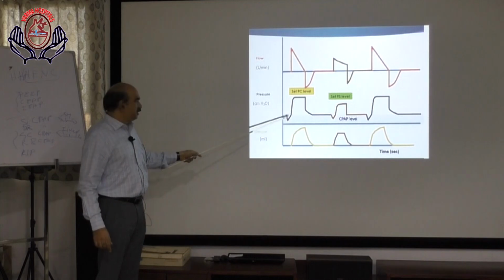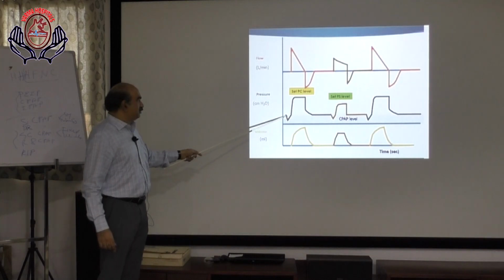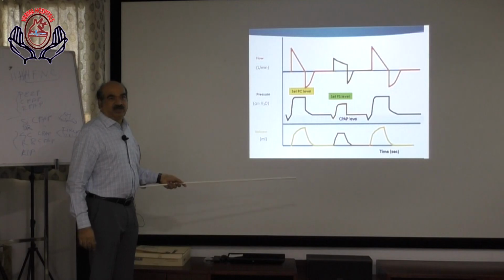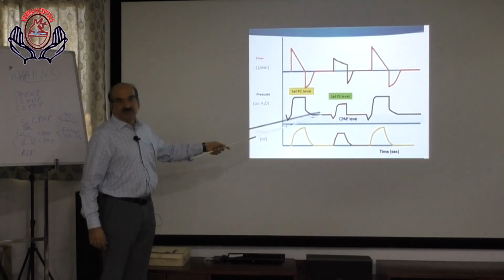Patient triggered, because there is an initial negative wave. So this is patient triggered. Then pressure support mode with CPAP. Patient triggered with pressure support and CPAP.